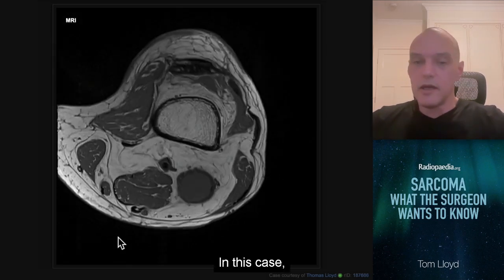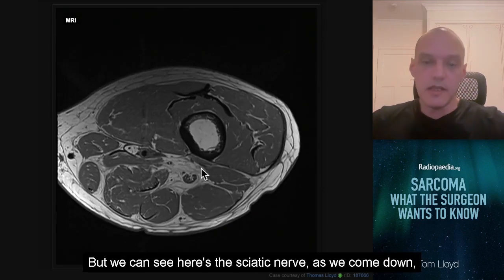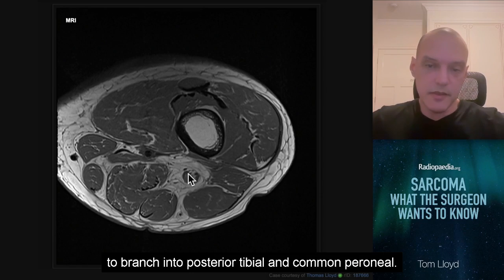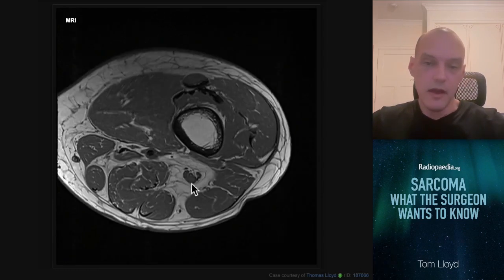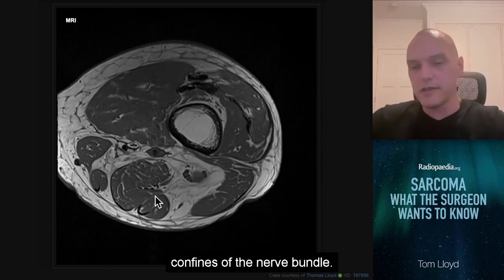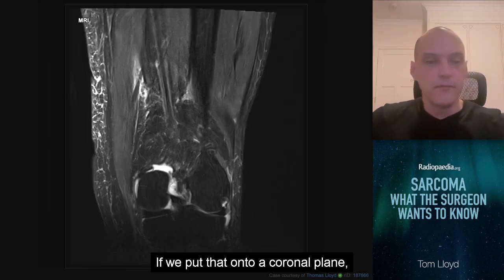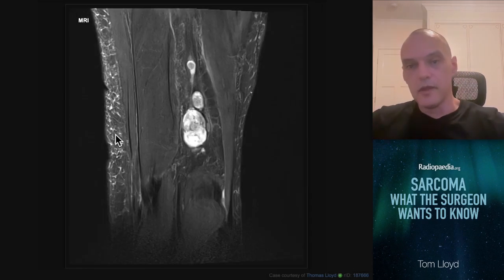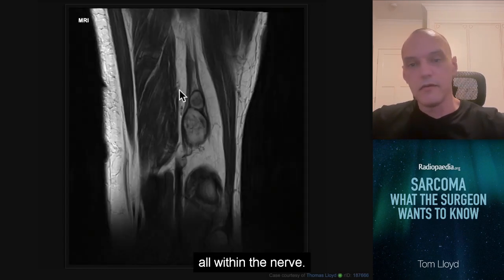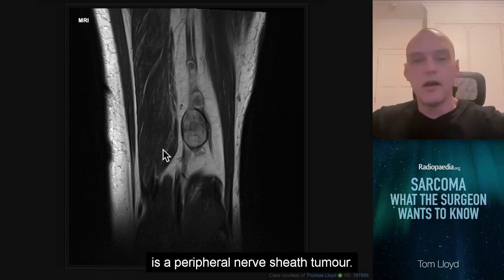In this case, we've actually got several peripheral nerve sheath tumours, this time in the posterior tibial nerve, but we can see here's the sciatic nerve. As we come down, you can see the nerve starting to branch into posterior tibial and common peroneal. There's a lesion within the confines of the nerve bundle. There's a second one, and there's a third one. If we put that onto a coronal plane, you can see 1, 2, 3 tumours all within the nerve. So that's a case where you can very confidently say this is peripheral nerve sheath tumour.